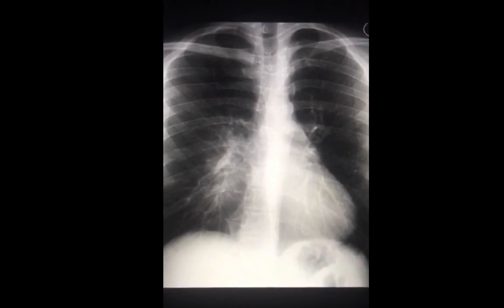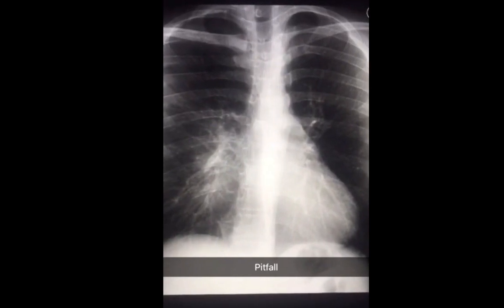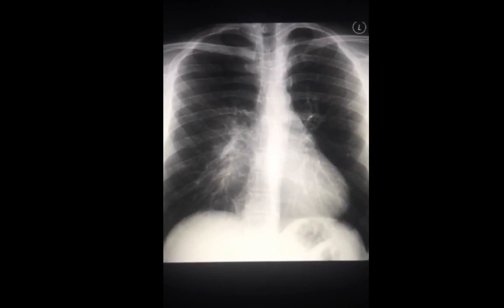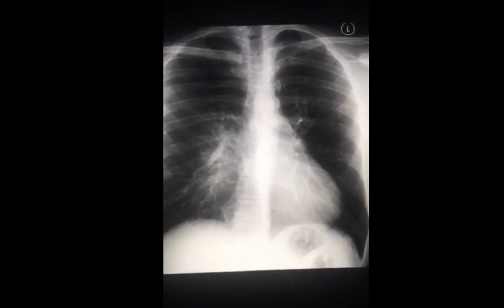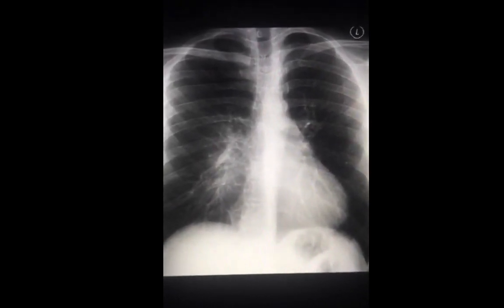It was not right middle lobe pneumonia or collapse. On frontal chest radiographs, pectus excavatum is a famous pitfall for right middle lobe pathology. Of course, examining the patient would make this less of a pitfall. However, when you read a chest radiograph, you usually don't have the patient around. To avoid such a mistake, always keep in mind that pectus excavatum may mimic right middle lobe pathology, then try to look for secondary findings.